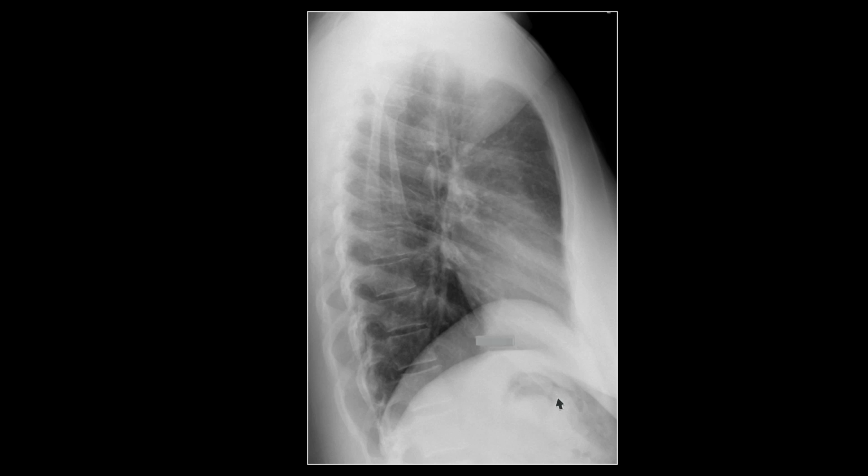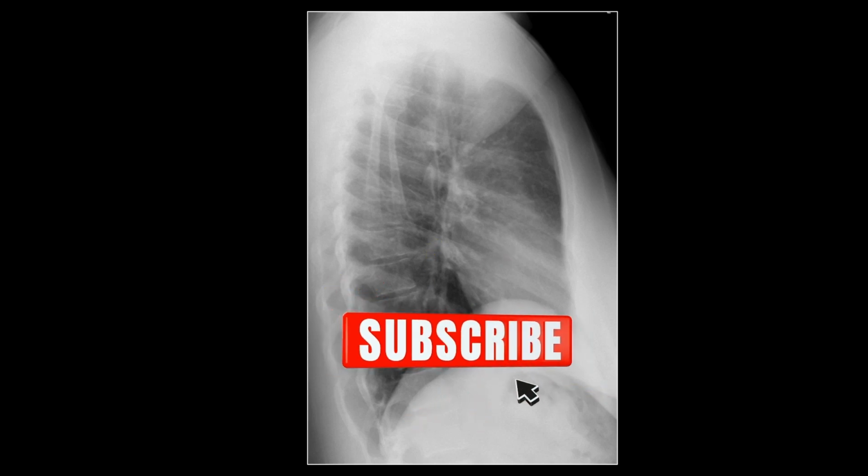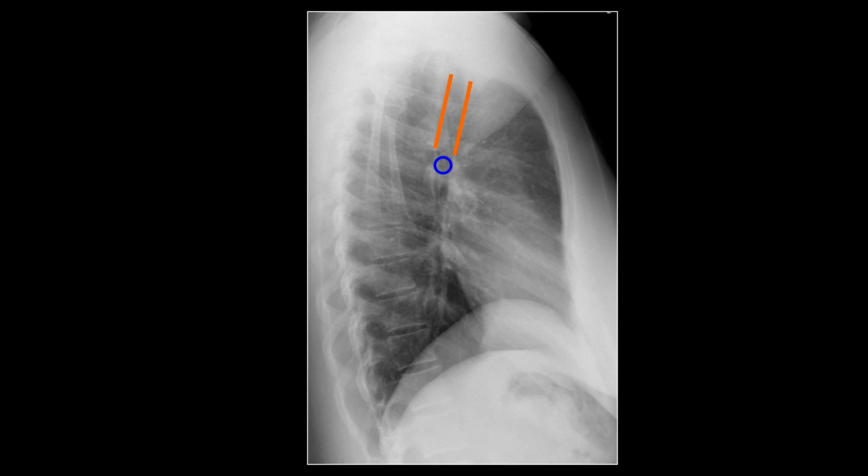Now let's quickly revise what we talked about. The lateral chest x-ray shows the trachea, the right upper lobe bronchus, which is superior and above the left upper lobe bronchus. Remember, you cannot see the main bronchi because they are oblique. If you look from the patient's side, you're going to see the two circles of the right upper and the left upper lobe bronchi. Additionally, we could see the aortic arch on the lateral x-ray. We could see a mini arch, which is the left pulmonary artery, and an oval or circle anteriorly, which is the right pulmonary artery. So the right pulmonary artery is anterior, and the left pulmonary artery is posterior.